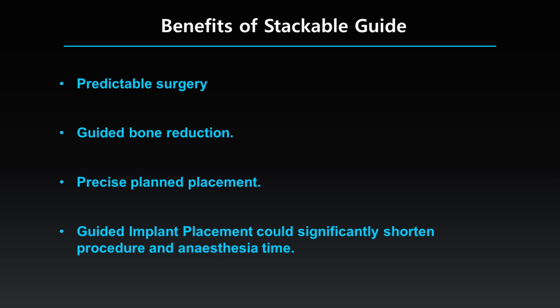Precise planned placement. Osteotomy guide facilitates accurate implant depth and trajectory. Guided implant placement could significantly shorten procedure and anesthesia time. The main benefits are that using stackable surgical guides in patients undergoing guided full-arch teeth replacement shortened procedure and anesthesia time and anesthesia recovery time, as compared with regular full-arch teeth replacement.